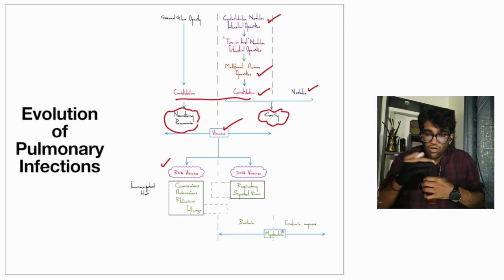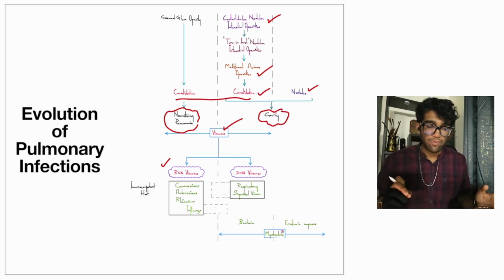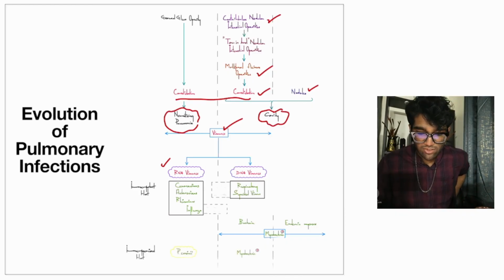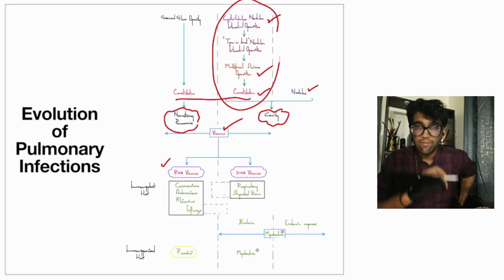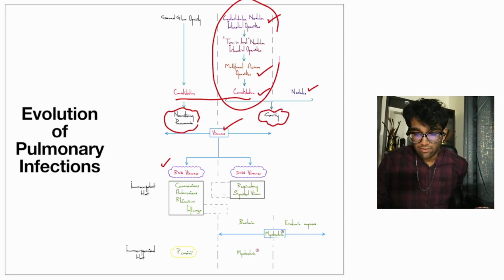So a combination of these together, a nodule and a consolidation, increases the probability of a pulmonary infection being the likely etiology. Now, in immunocompromised hosts, the etiology also changes. So mycobacterial infection, that is specifically tuberculosis, passes through these four stages, but again it depends on how immunocompromised the patient is. If the patient is very immunocompromised, mycobacterial infections may produce completely different patterns, particularly the random pattern or the miliary pattern, random nodular interstitial pattern. So we'll come into that in detail.